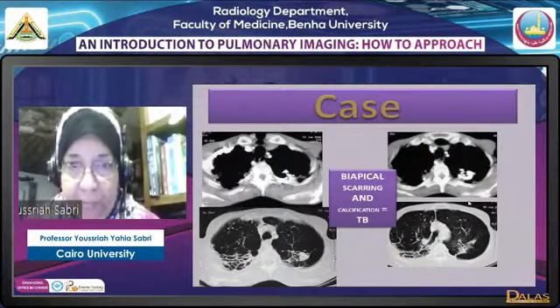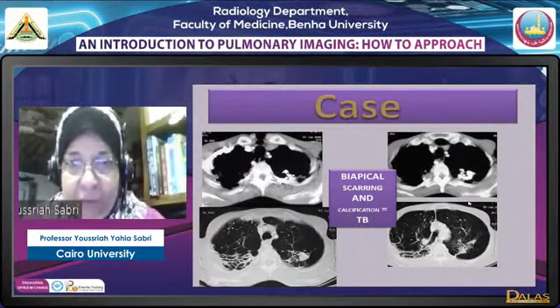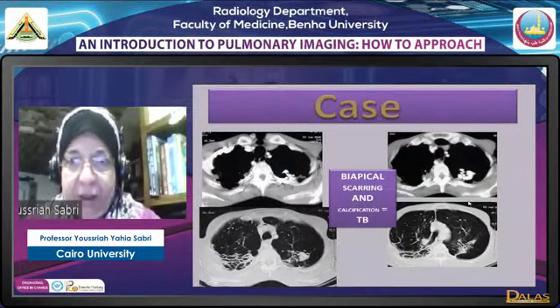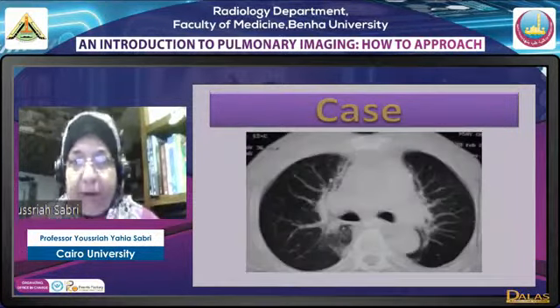Bilateral upper lobar fibrosis. We have seen miliary TB, we have seen bronchopneumonia of TB, we have seen the pulmonary Ghon focus, we have seen now fibrosis, and effusion.